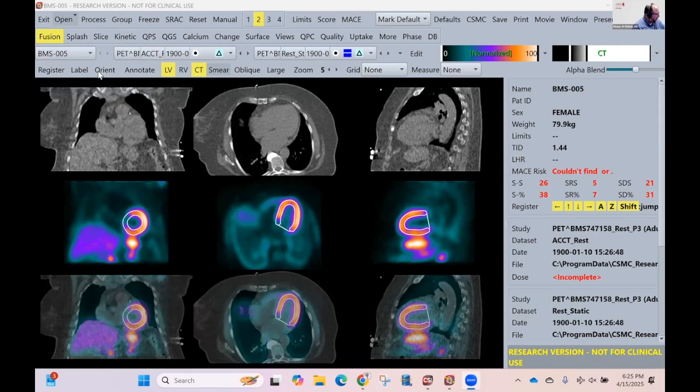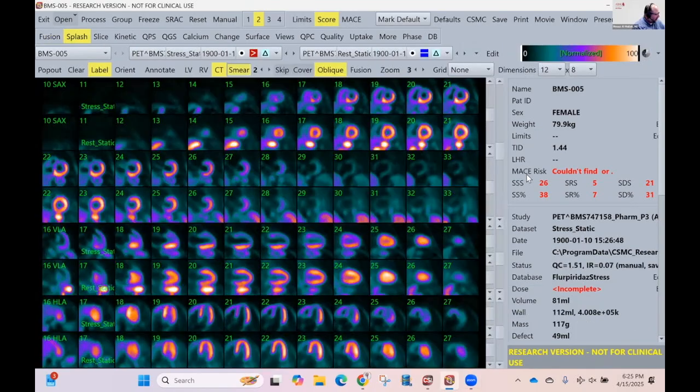We check it. So from now on, we're gonna move like the quality had been checked unless there is a specific quality point that we want to make. So maybe I'll ask Marcelo, or if you wanna walk us through here what you see.